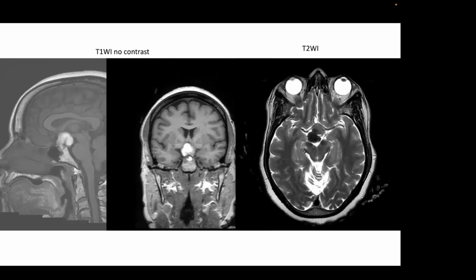But I think what I like about your diagnosis is you see the sella is normal in size. And that's very typical with metastatic disease to the pituitary gland, that the tumor grows out of the sella without enlarging it because it's growing so rapidly. So very good thought. Any other considerations?